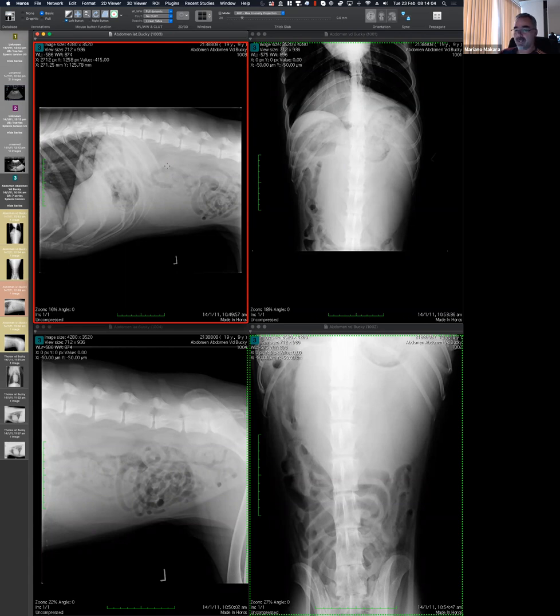So perfectly fine. I think in this case, the content of the small bowel is helping identify what looks like a mass. Coming back to that discussion about the mass and mass effect, I don't think we should have any question or be very hesitant in calling this a mass, because it's acting like a mass.